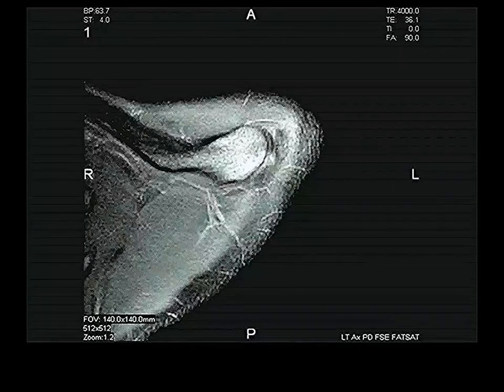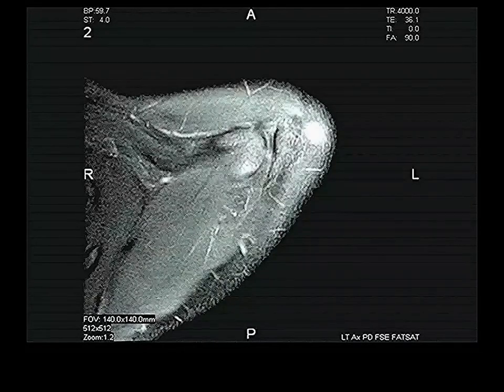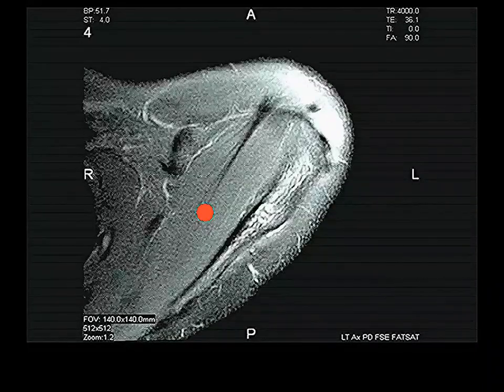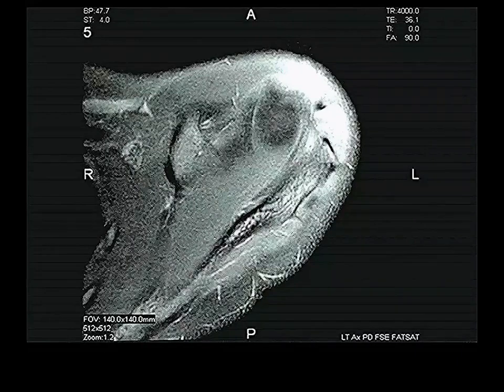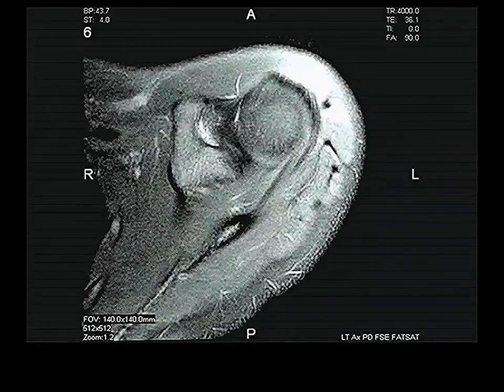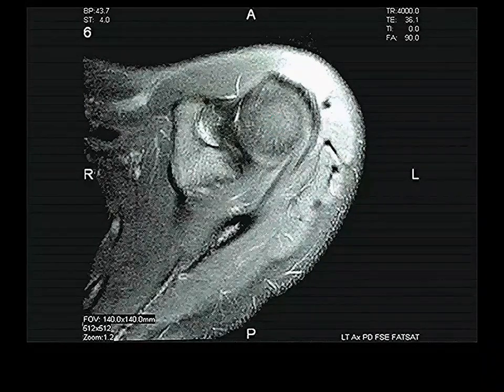Now we're going down. I'm not going to spend a lot of time on this. Going down from the top of the shoulder inferiorly. This is the person's clavicle. I'm not going to ask you but one question about this. Here's the supraspinatus. Here's the origin of the coracoid. Here's the rest of the coracoid. Here's the head of the humerus coming into view as we start at the top and head distally.